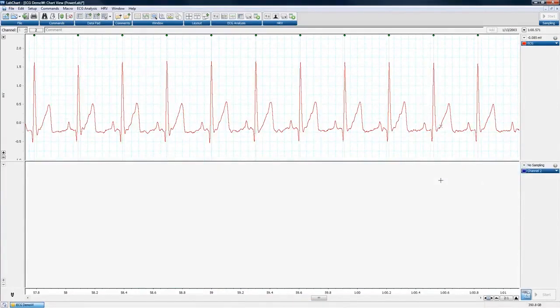there are actually ECG analysis channels as well. And these will, if we select for things to update in real time while we're recording, these will calculate and update in real time and continue as a trace. So how do I access these? I add a new channel.